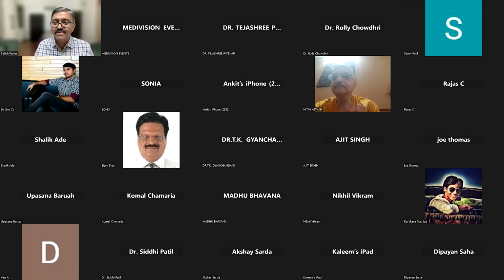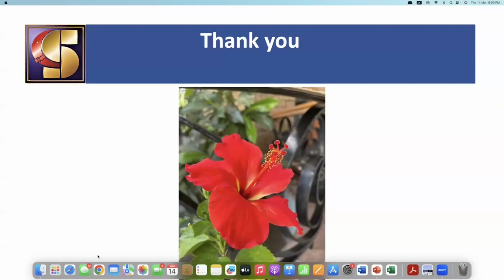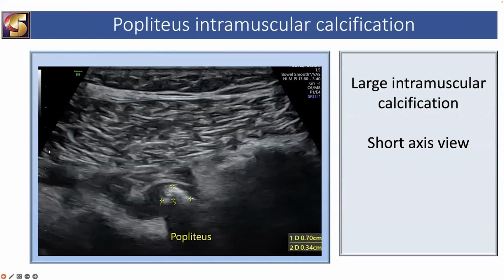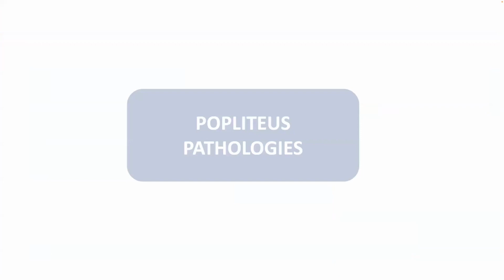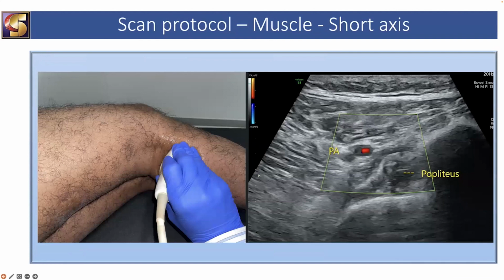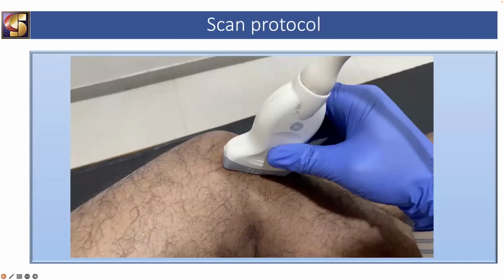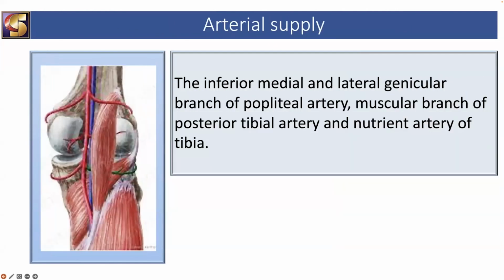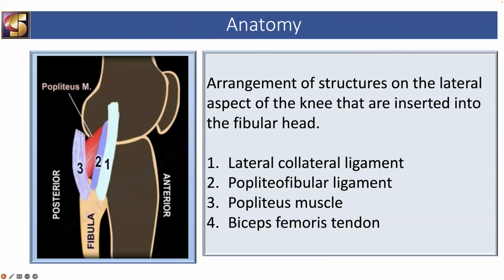Okay. So, sir, you want to show that slide, or if it's difficult, then we can show it. Yes, but I have to show him the checklist. Yeah, one second. No, the previous one, Satish, where you can see all three structures. Or this one? Yes, this one.